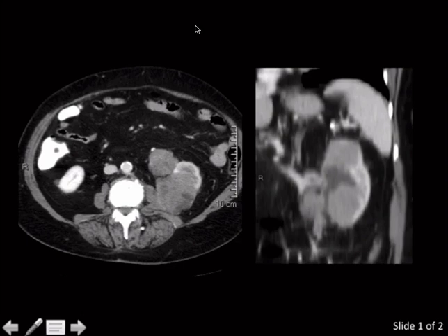They're homogeneous, and they're not really enhancing that much relative to the cortex. So the cortex is a nice thing to use as an internal control, especially on a corticomedullary phase, which this is. So just as a rapid review, remember we said clear cell renal carcinoma will enhance avidly, equal to the cortex on corticomedullary phase. Papillary subtypes tend to enhance less than cortex, but they still enhance.